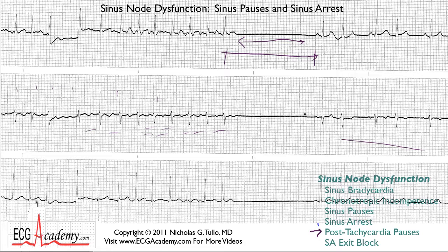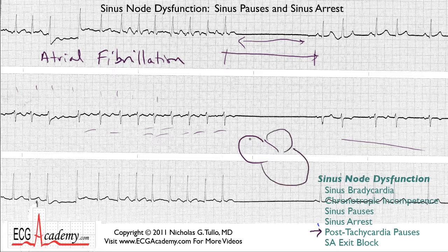Maybe the patient came off the electrodes, one of the wires fell off. But it turns out that this is a particular rhythm disturbance known as atrial fibrillation, and we'll get into this in a later section. But atrial fibrillation occurs when the top chamber of the heart has an electrical disturbance that results in very rapid, irregular, chaotic activity all going around in different directions.